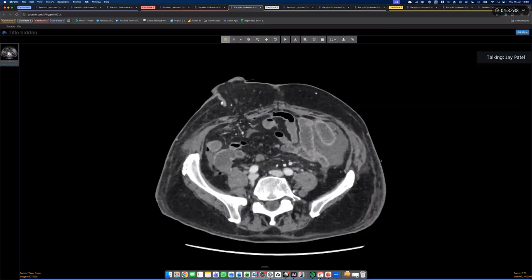Just summarize the case for me. Yes, sir. So I've been presented with post-contrast axial abdomen images. I can see that there is discontinuity in the rectosigmoid, discontinuity noted in the region of the left iliac fossa. There also appears to be a surgical clip in that. So this is a surgical emergency, and I would urgently pick up my phone and inform the surgical on-call team and let them know about the findings and would compare with the previous reports. Good.